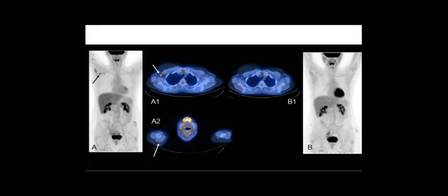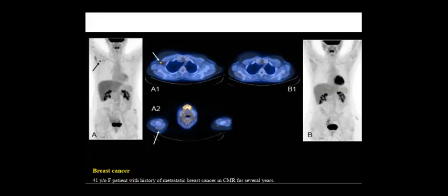Breast cancer, yes. So this patient maybe did conservative breast surgery, and he had axillary lymphadenopathy. At the next follow-up, he didn't have anything. So this one is easy and solved, that he had axillary lymphadenopathy and took treatment, whatever the treatment.